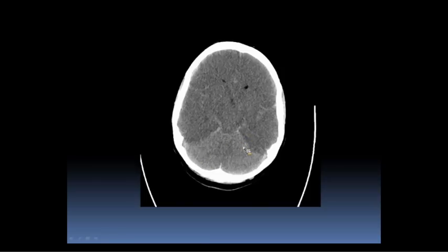So this is called the white cerebellum sign, and essentially it's just diffuse anoxic injury. You can also, with diffuse anoxic injury, just have basal ganglia involvement in some areas that have higher metabolic requirements. But generally the hallmark for anoxic injury is kind of symmetric bilateral abnormality. So it can be bilateral basal ganglia. It can be even the hippocampus and the perirolandic areas as well, because they also have a little higher metabolic requirement.